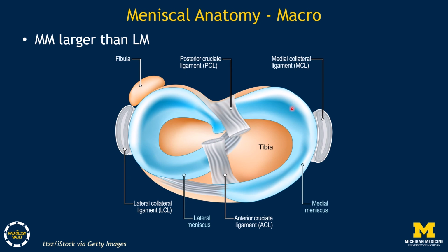Each meniscus can be subdivided into the anterior horn, body, posterior horn, and the roots. The anterior and the posterior roots typically attach to the central tibial plateau, serving as anchors and maintaining a normal meniscal position and biomechanical function. The medial meniscus is larger than the lateral meniscus.